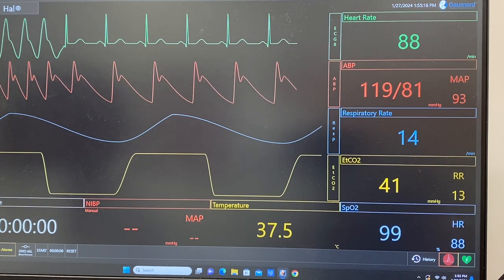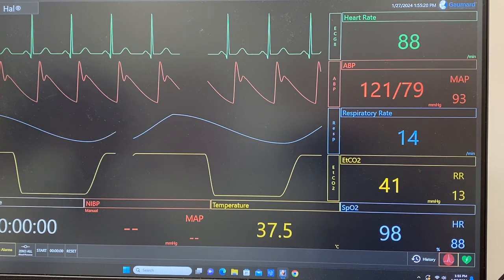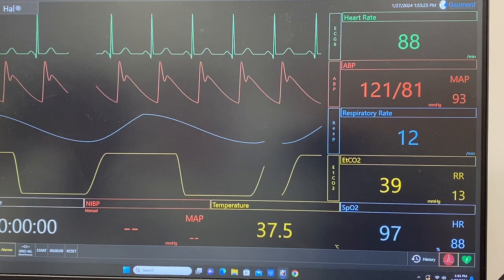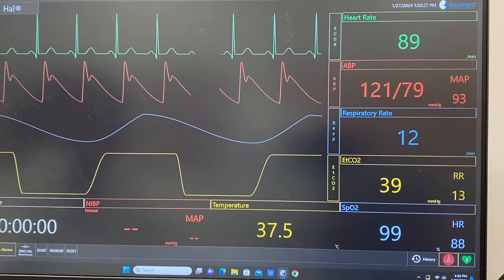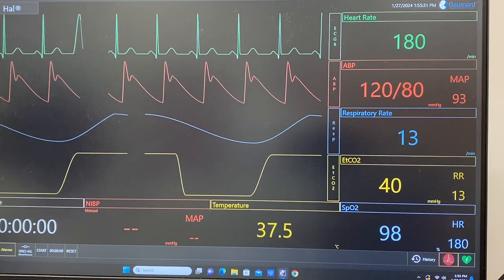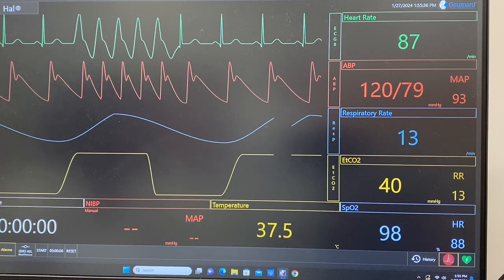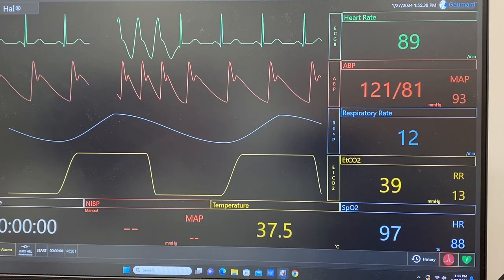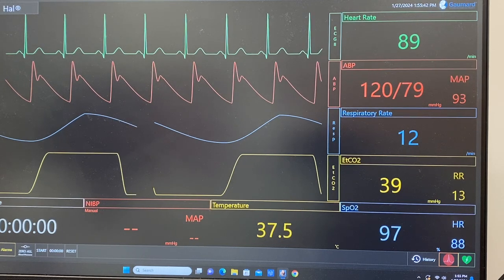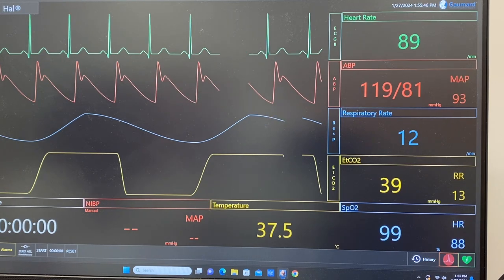So based on what Jessica had earlier, right? You know that those are the ones that were abnormal. Ventricular tachycardia. What is it called? PVC. Oh, the PVCs. But what's wrong with these ones here? Multifocal. Well, do they all look different? Look at your list again.